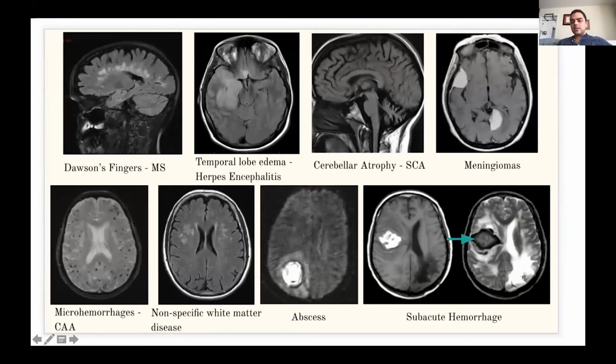This is a T1 post-contrast scan. I don't even have to think about that much. I mean, it's clear based on the white matter being white and the cortex being dark that it's a T1 image. And these are clearly dural-based round lesions growing into the intracranial space. And that's a classic sign of a meningioma. And the only time you'll see a meningioma this bright and prominent, diffusely enhancing, is in a T1 post-contrast scan. So you always want to identify, are you looking at a T1 pre-contrast or a T1 post-contrast?